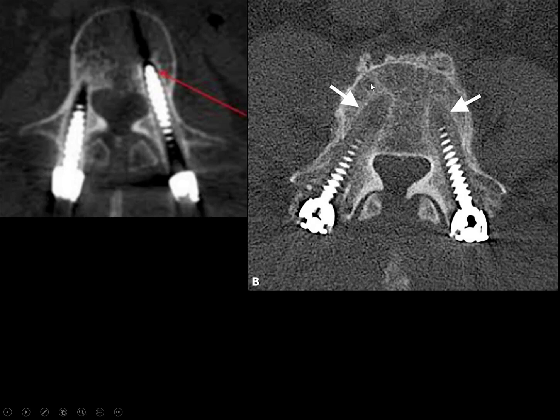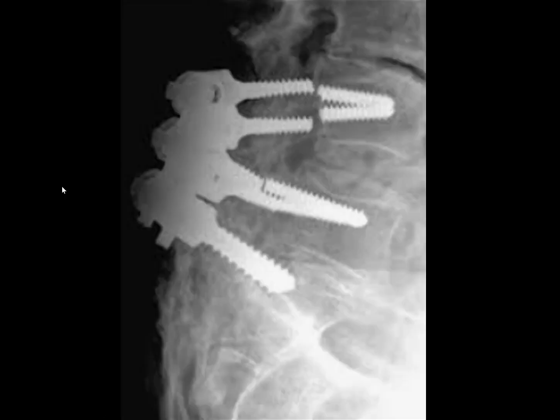Usually you get something like this over time. You get halo loosening, where you get motion, and you can imagine the spine is moving and the screws are staying still, and it creates sort of a hole where the screws are. See that? It's called the halo loosening sign. This is from a non-union. So the implants worked fine. It's just that the fusion didn't take.